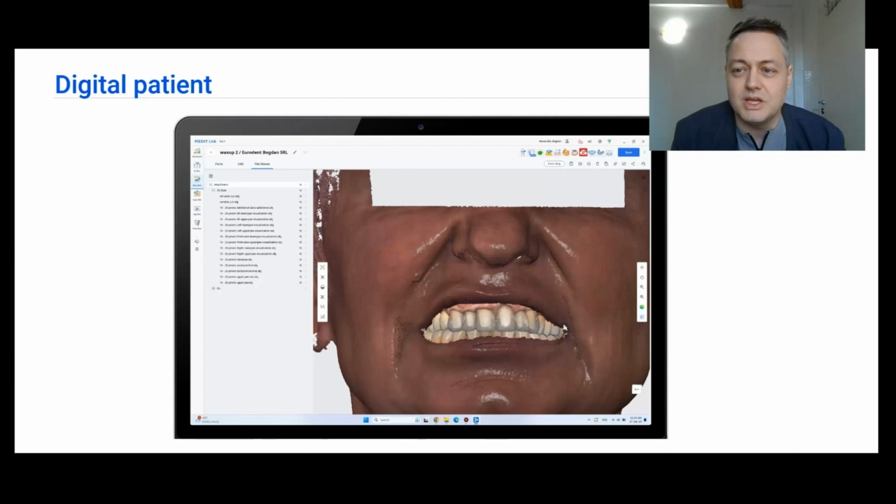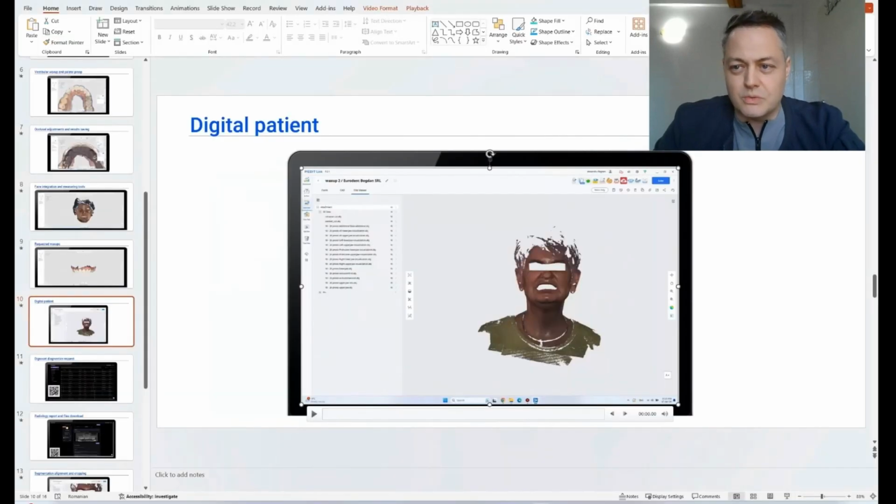So, with that being said, we are now going to get to a new step of building these wax-ups and actually getting the hard tissues of the patient from their CT. To be able to do this, we are going to use a platform that I discovered some years ago and I am very fond of. It's called DiagnoCat, and first, when I found out about them, it was doing segmentation, but I have also seen some nice surprises that I'm actually going to share with you right now.